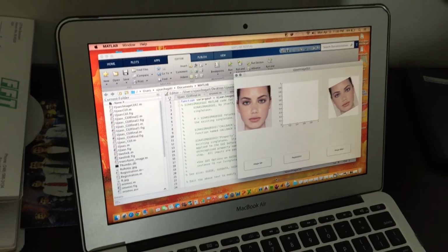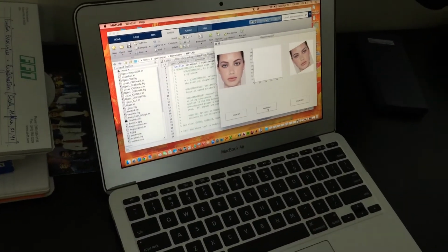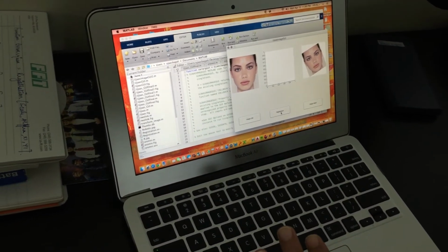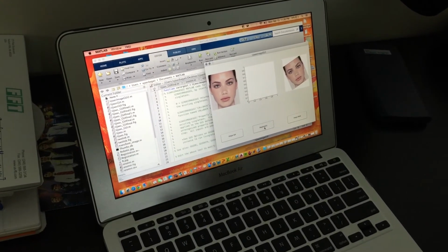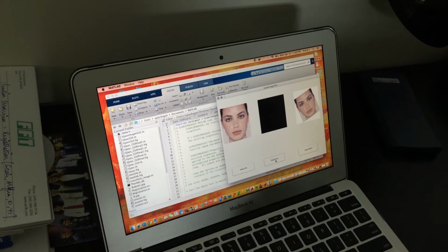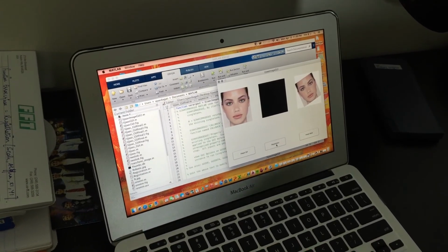Now what usually happens is that if I click the Registration button, which I have coded for optimizing the two images together and giving the resultant image, in a general case we do get the optimized image that we are looking for, and in most cases we do get that, but I am actually not. If I click on this, I get a black screen, and I'll try to fix this and get back to you guys and show you the exact optimized image that I can come up with. There are just a few changes that I need to make, and I should be good to go.